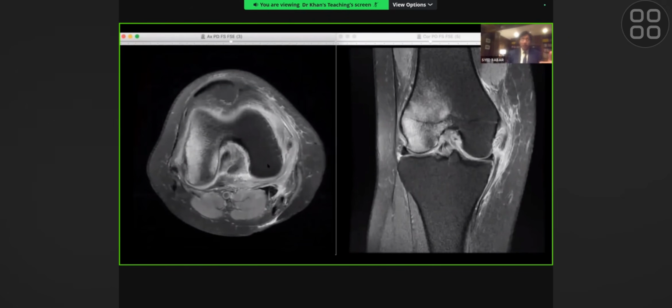In conclusion, I would say to the examiner, there is significant bone bruising of the lateral femoral condyle, implying an impact site of the injury. And as a result, there's disruption. There is a grade 3 complete, if you don't want to use the word grade 3, use complete disruption of the femoral attachment of the MCL, resulting in extrusion of the medial meniscus. It has also damaged the medial patellofemoral ligament, which is edematous and thickened, but not completely torn.